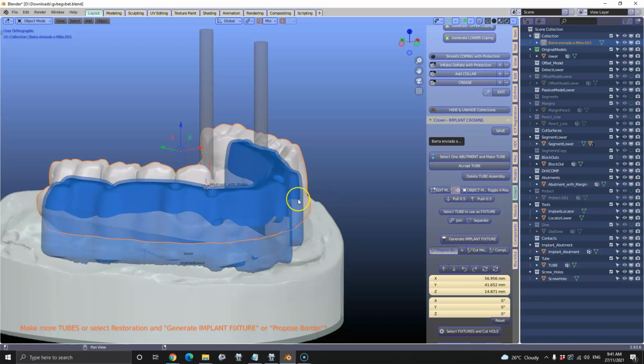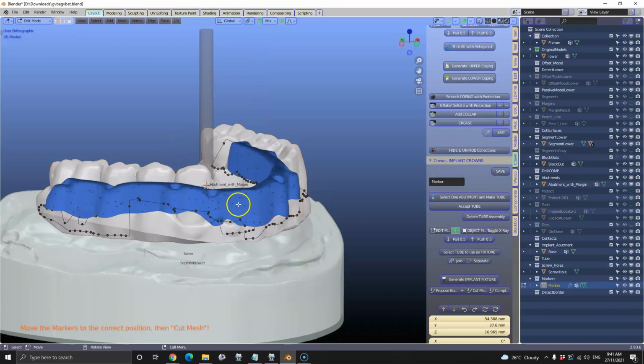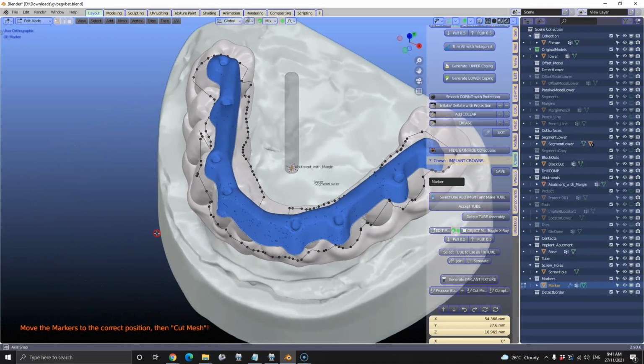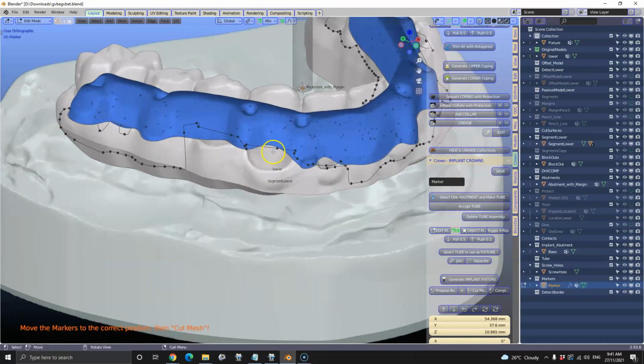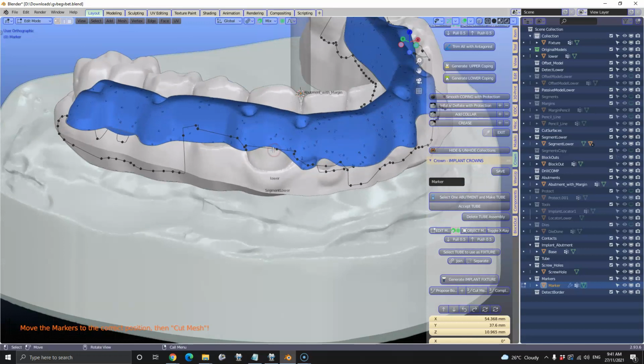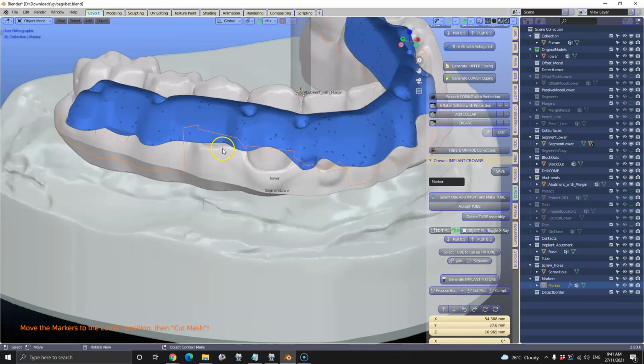Now this border could look irregular at this stage because it's a very complicated bridge structure, and also it has to come out all the way, so it's coming out a long way. So this does not look acceptable, okay, but that's okay. We can change that. Tab to get out of it.